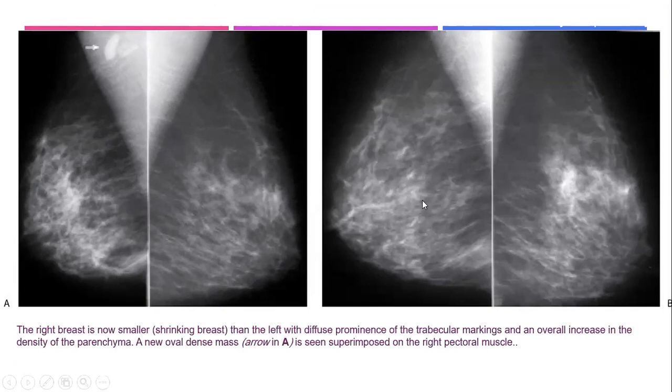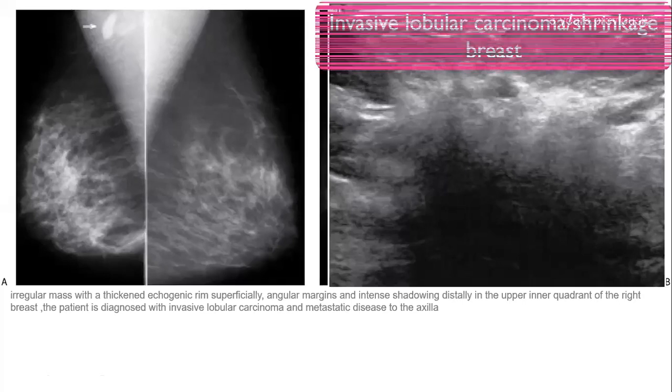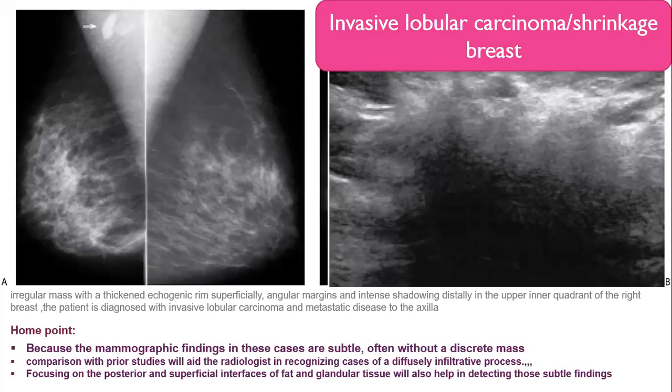We forgot to say this is the earlier mammogram and this is the recent one. You see, when we compare, we can appreciate the changes between the two, and definitely the site of interest is the right one. So it is important to look for the prior mammography, okay?